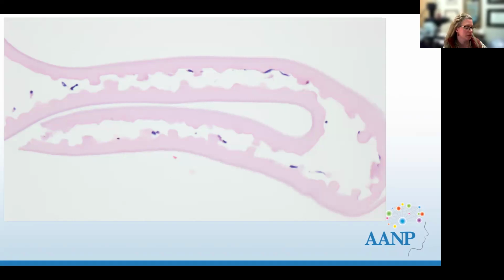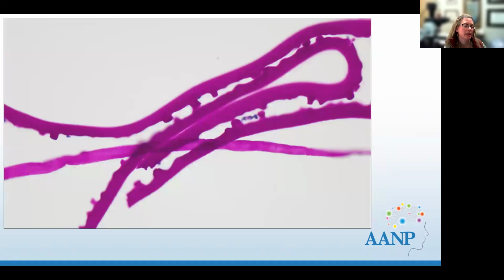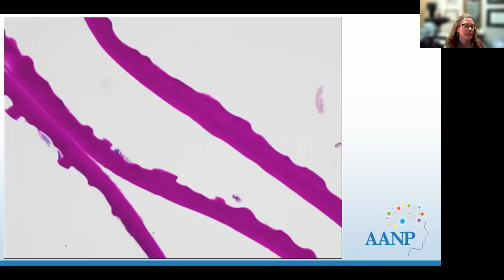And so then again, we do H&E, PAS, H&E, PAS. And these bake overnight at low temp to be able to stick to the slide. If you look at a PAS, we're going to look at probably way too many of these. You can see these guttated excrescences that stud the membrane, and they're all different sizes. You see how thick the membrane is, and sometimes they're buried within there. And you see that there are very few endothelial cells. So when I sign these out, it'll be thickened membrane, PAS positive with guttae, and rare endothelial cells.